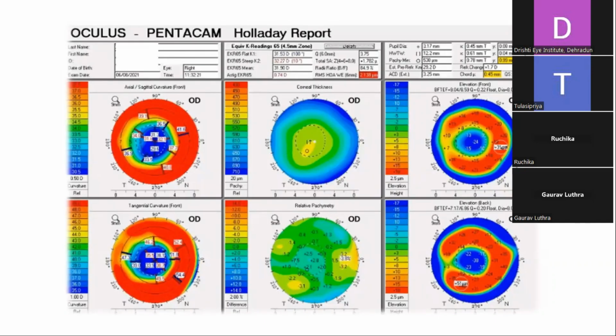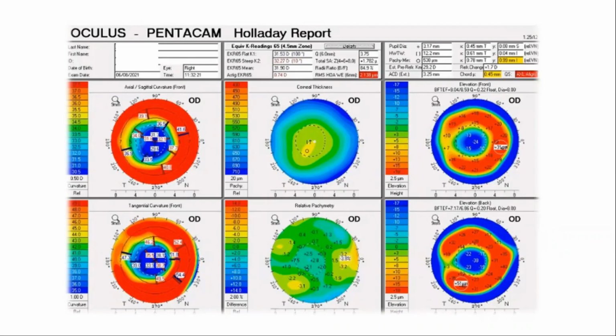The EKR report is basically not the net power of the cornea. While calculating the net power, the device measures both the anterior and posterior corneal values and gives the total corneal power. But this value cannot be used in any normal IOL calculation formulas like SRK/T, Holladay 1 and Hoffer Q. So this report actually helps to avoid double correction while using these formulas.